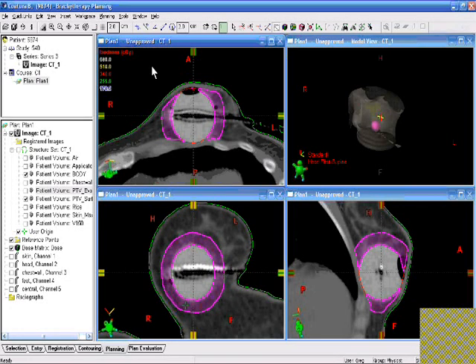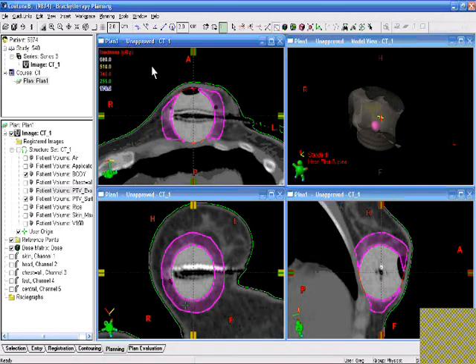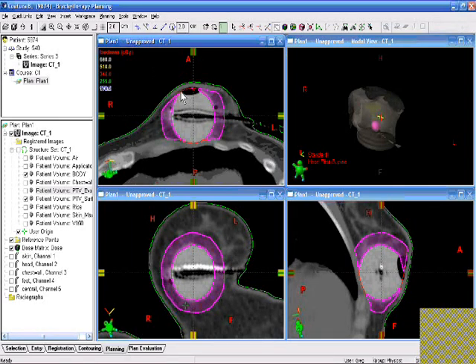It also depends on the particulars of an individual patient, whether or not they might have had a close margin in a superficial direction. So what I recommend is that you always create this PTV surface at 5 millimeters from the skin, but that you create the PTV eval to be whatever the physician wants to actually treat.